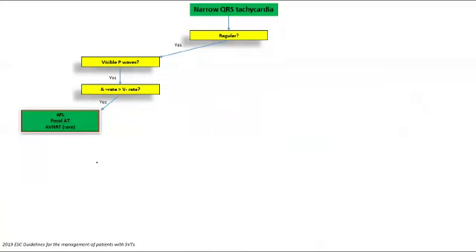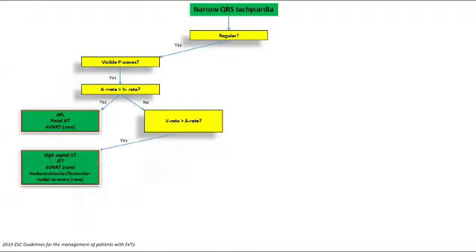If your atrial activity is not faster than the ventricular activity, you then need to reverse the question and ask yourself, is my ventricular rate faster than my atrial rate instead? In that case, you have to consider these differentials.